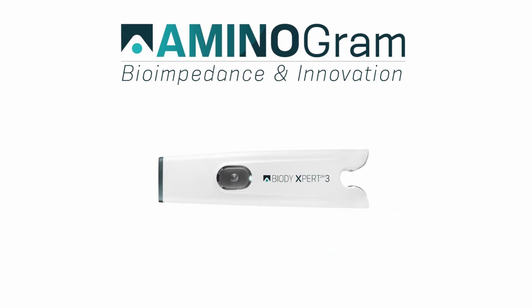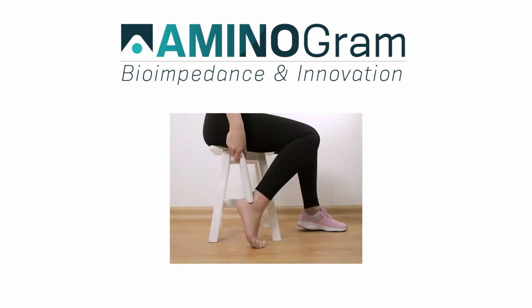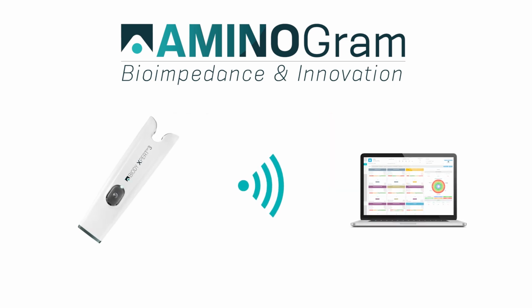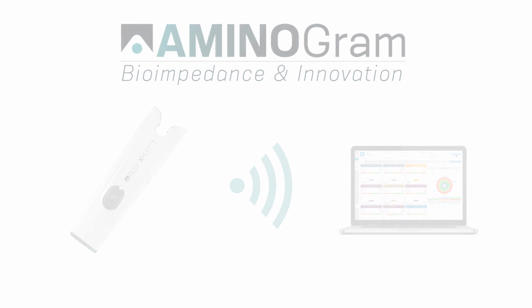First, let's start with a reminder of how your device works. The applications paired with BIODY impedance meters require internet access for analyzing the measurements. The operation is as follows. The patient performs the measurement, and then the impedance meter sends the data via Bluetooth to a terminal. Let's now move on to the installation of your device.